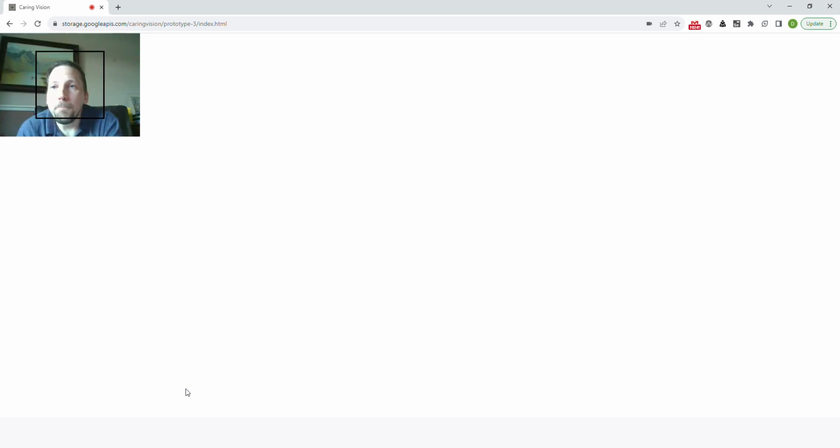So start the assessment. And the first thing it's doing is loading all that complicated background data in. And as it does so, you'll see a picture of yourself appearing on the screen any second now. And then the next step will be the actual starting the assessment. There I am. And again, nothing's happening at the moment because it's still trying to load all the background tasks, and there it's now ready to start.